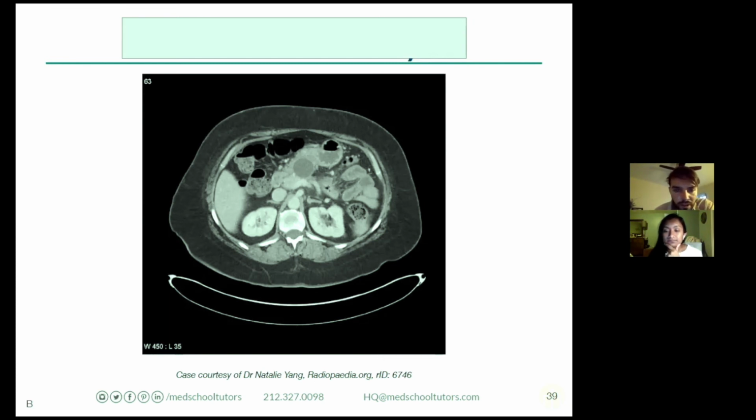So I want to look around and see our vertebral bodies, our kidneys, a little bit of the liver we can see here. Thank you so much for guiding the cursor. Of course. And then as we move across the abdomen, we see a couple loops of bowel here with air, and then we're moving through.